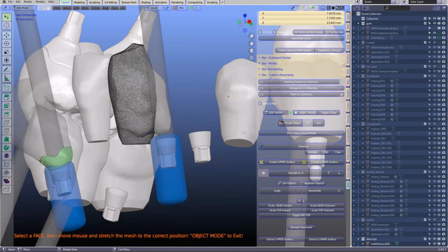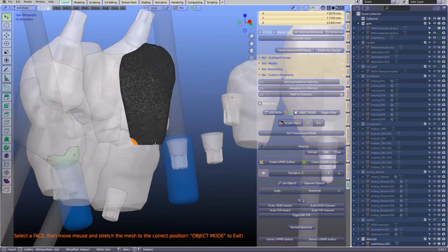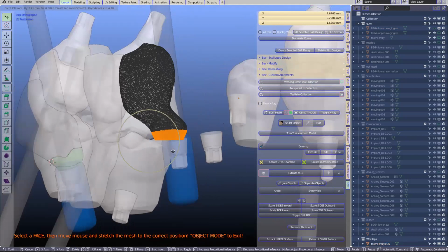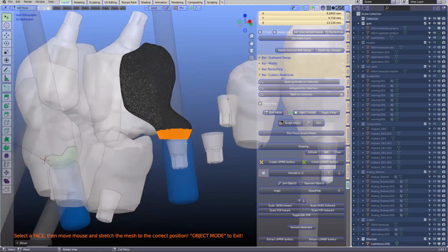Edit, transparent, like that. Use the G key, like that. The workflow is always the same. Doesn't matter what. This looks a bit wonky. Hey, this looks a bit weird. Alt B.